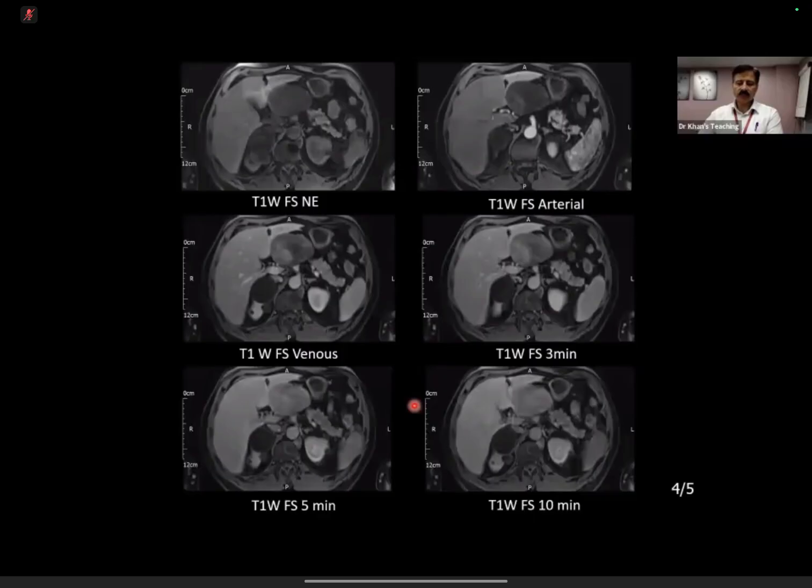What is happening inside the lesion, but vis-a-vis parenchyma, what is happening? If you see parenchyma, arterial phase, parenchyma is enhancing. Within the lesion, there is just a bit of enhancement. Rest is not enhancing. It never becomes equal, but within the lesion, there is a bit of delayed enhancement. So there might be, let's say, some component which is enhancing.